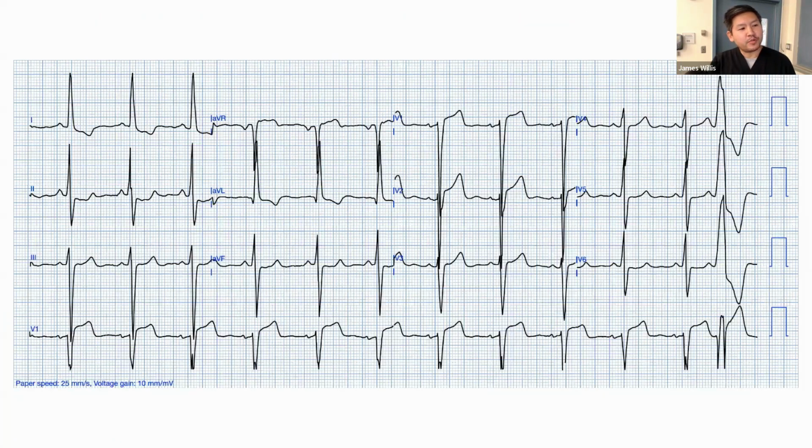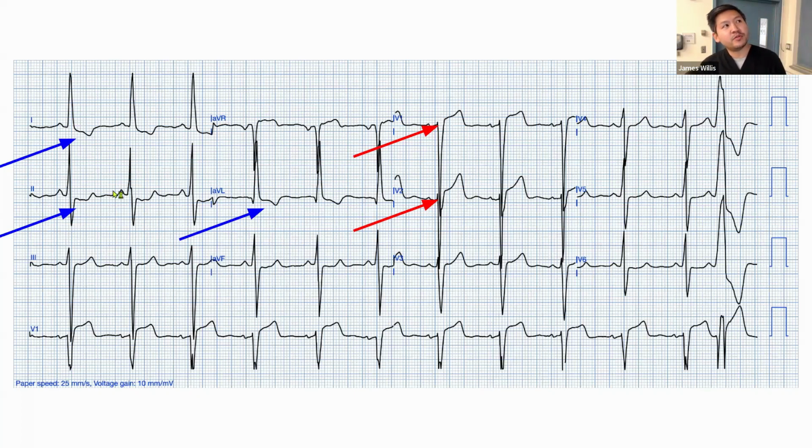All right, so just another example. This one's a little bit more difficult, but I think this is a real case, and I probably may have sent this patient home. This is a ST elevation, but in a really deep S wave. And here you have some depressions with tall R waves. With this patient, you really have to go by clinical presentation, because this ST elevation does look pretty big, and these ST depressions look kind of flat, unless strain pattern, which we'll go over.